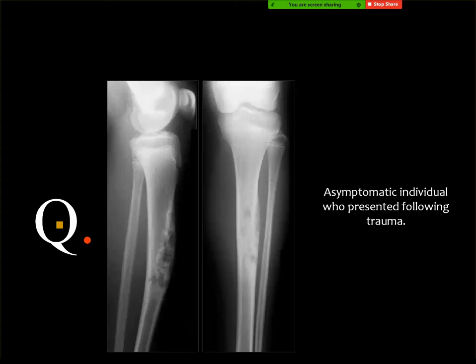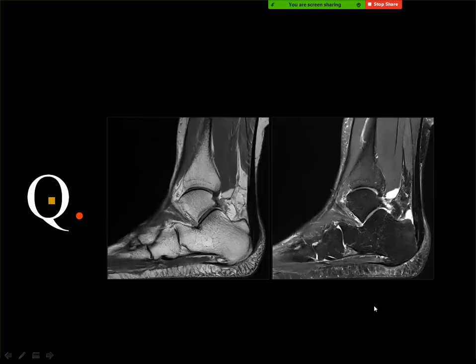Adamantinoma, this is of tibia. Yes, and this is a spot diagnosis lesion, which is located in the anterior part of the tibia, and the tibial shaft is a little bit bowed. Then you know that adamantinoma occurs only in two bones, the mandible and the tibia, and this is one of the classic appearances of adamantinoma.